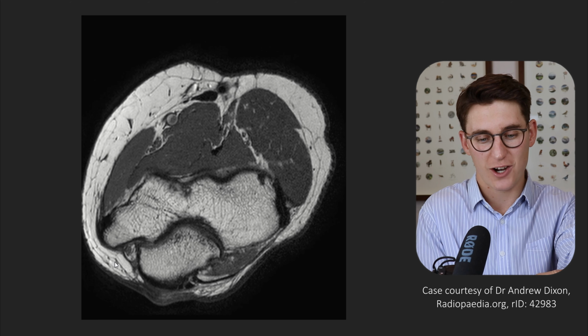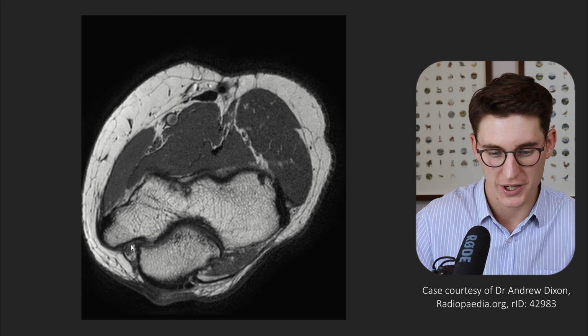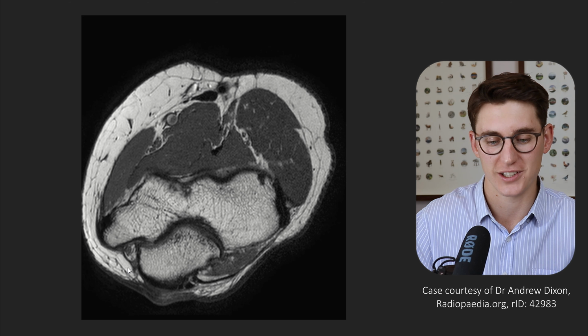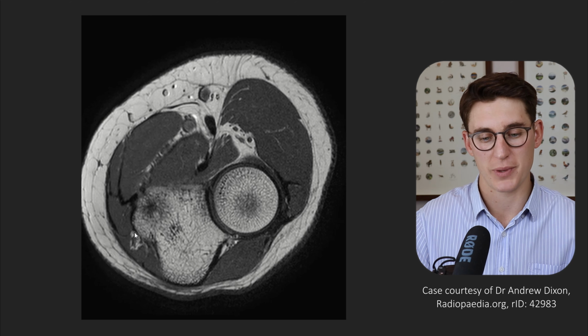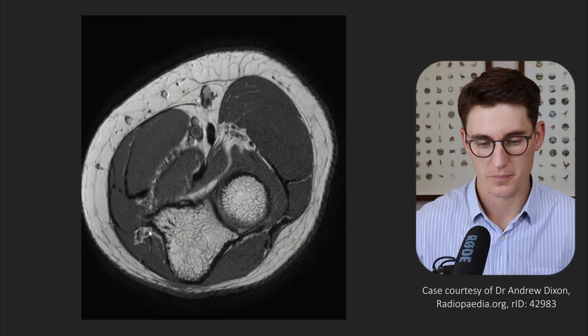You can see how superficial it is. This is our funny bone. If we were to apply direct pressure here, putting pressure on that ulnar nerve and our medial epicondyle, we'd get that nerve-like pain shooting up through our arms. That's our ulnar nerve heading down. It gets embedded in this flexor carpi ulnaris on this side and heads into the forearm.